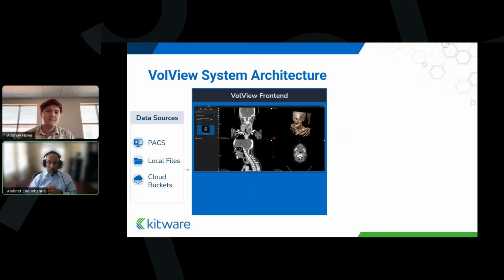And we'll see a demo of this in action. This was basically where the users spend a lot of time, where you are visualizing the data, looking at different layouts, doing annotation, and generating segmentation models. All this is happening on the client side. When you're interacting with your data in the browser, your data remains in your browser.